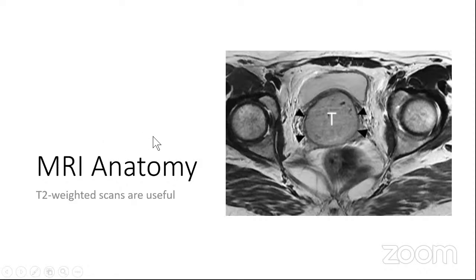So, coming on to MRI imaging for cervical cancers. As I told, there are lots of varieties of MRI we could take, but the most common and useful variety is the T2 weighted MRI scan. T2 weighted MRI scans display fat and liquids in white color, and the solid tissues appear darker. These are some changes that could be seen in T2 scans. For delineation of cervix cancer, the mass and its edges are much more visible in a T2 scan.